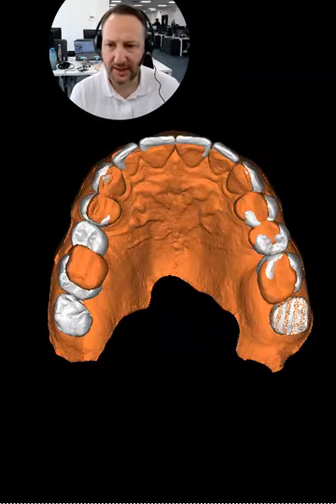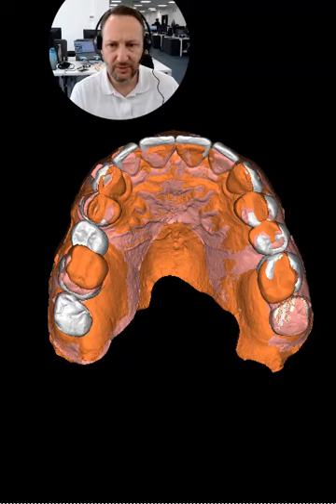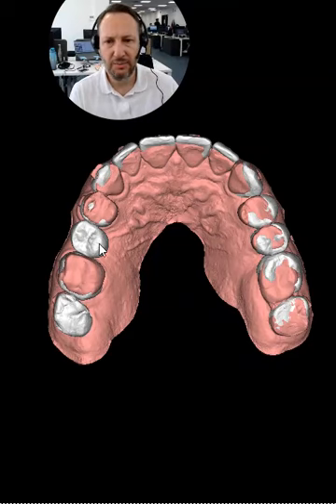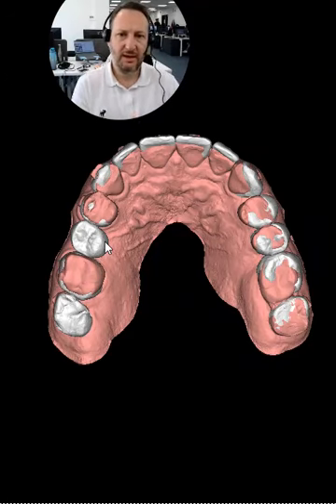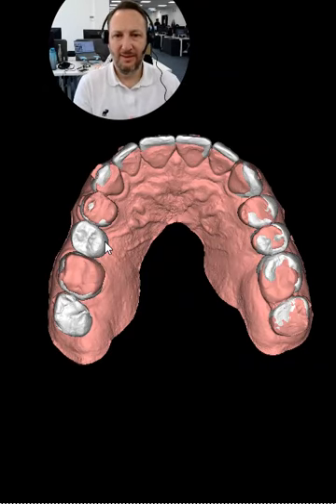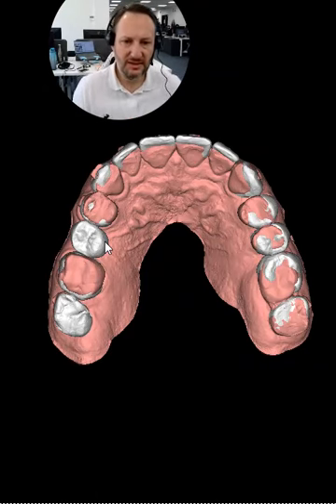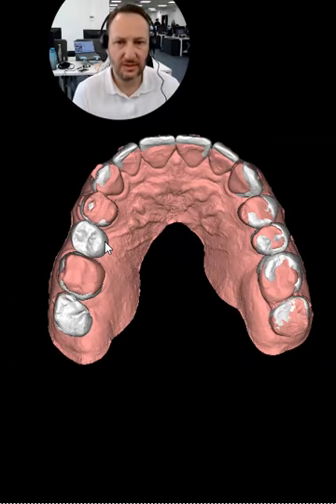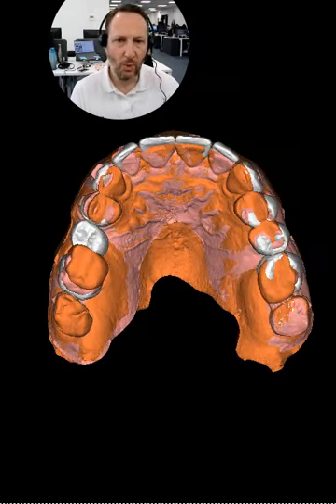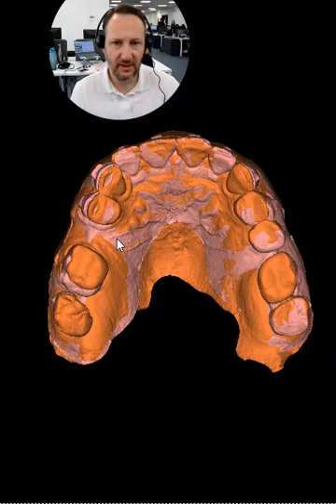After one set of aligners, we can have this outcome, and now we could move it to a better position, and the implant is going to be placed in the ideal position. So this is the importance of planning the case, simulating all the possibilities in the computer in an interdisciplinary software in advance, so we can better understand which specialties can be involved.